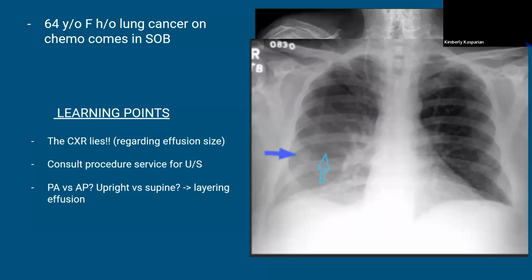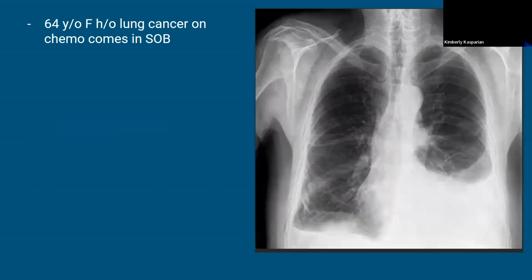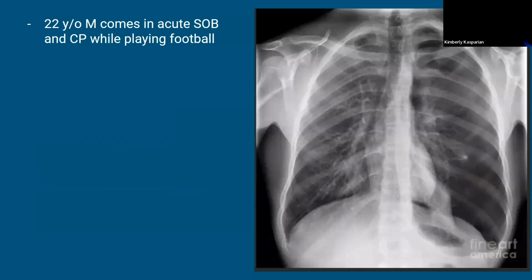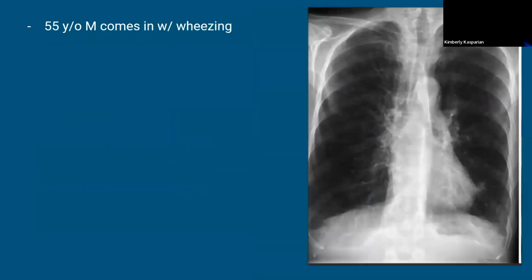I always had that line on the left lung. Oh, right here? Yeah, so those are the scapulas. That right there, it's going out that way. No, it absolutely has fooled me. I literally have thought I've seen a pneumothorax before looking at that. So yeah, it's just tracing the scapula. That one's still kind of hard to see, but yeah, that's scapula.